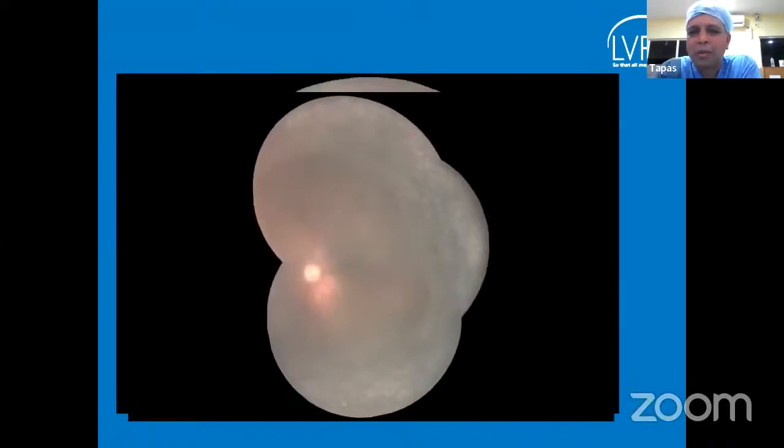So, though fundus fluorescein angiogram definitely gives us better insight and more confidence, if we don't have these gadgets available or doing it is an issue, red-free imaging does give us an adequate idea to take a decision on treatment and follow-up. I thank you all again, and stay here and continue.